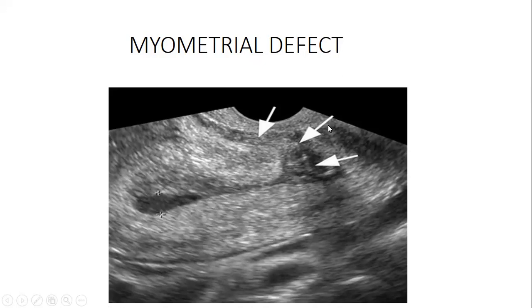Depending on the bleeding, if the patient's hematocrit is dropping, they can bleed more than this, and it can also spill into the paravesical space. But the key issue is to understand the approach. I should mention here that TVS also plays an important role in appreciating this.